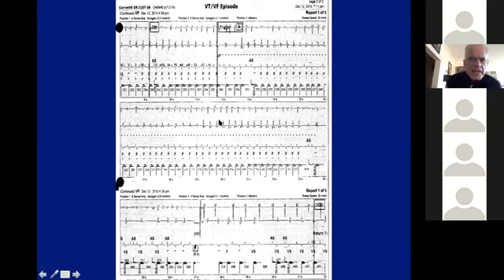And then it organizes a little bit here. The electrogram looks different, so probably ventricular flutter. And then it breaks. It breaks, and here it's interrupted, right? Why does the device shock here? You have 3 beats that are faster. The device was already reconfirming, getting ready for a shock. You got 3 more beats. Boom, it shocks, actually not for a good reason.